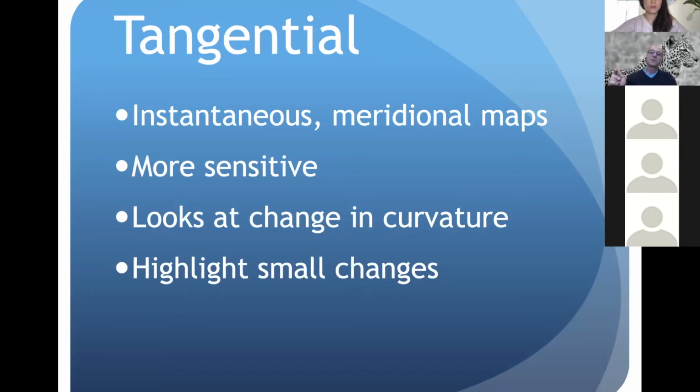And that's important to remember, because when we look at some of these maps afterwards, you'll see that there may be a red zone, and it may not necessarily represent where the cornea is steep, but rather it may represent where the cornea is changing more rapidly. For instance, we'll see later in a myopic PRK or a myopic LASIK, there's a red zone, and we can use that change to help us with looking at post PRK or post LASIK patients.